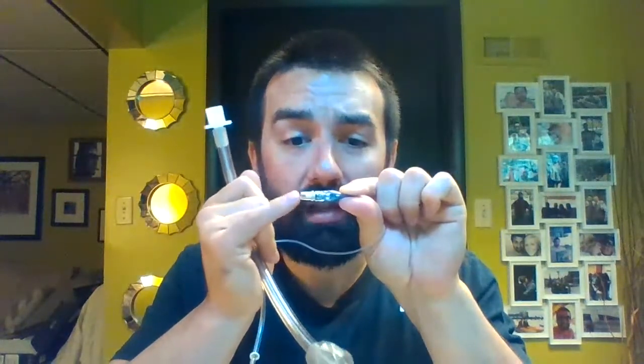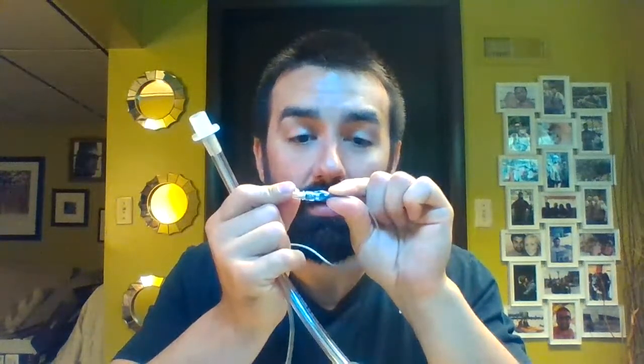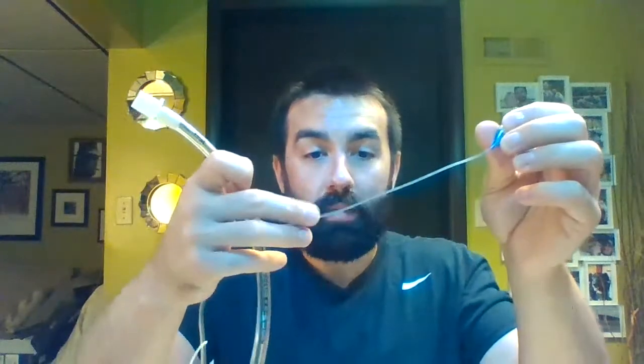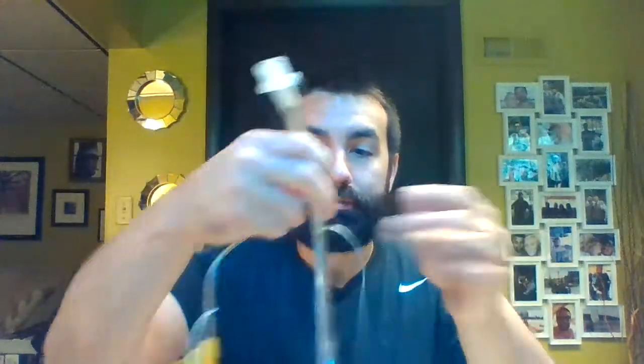The pilot balloon has a little spring-loaded valve here that'll take on a syringe drawn back and filled with air. It allows us to facilitate air through that pilot balloon into the pilot line. So the pilot line is the part coming from the balloon going down to the cuff. Okay, and we're going to talk about all this in the troubleshooting video a little bit later on. So pilot balloon, pilot line, cuff.